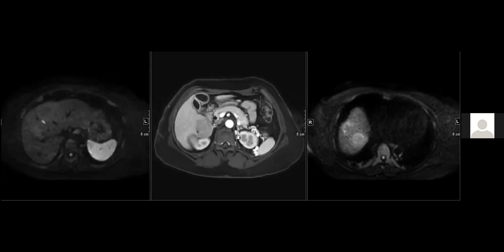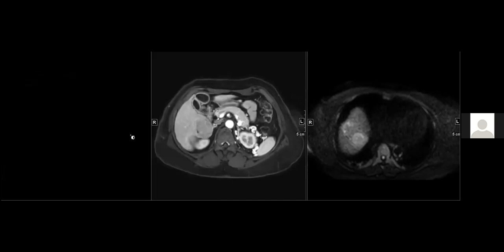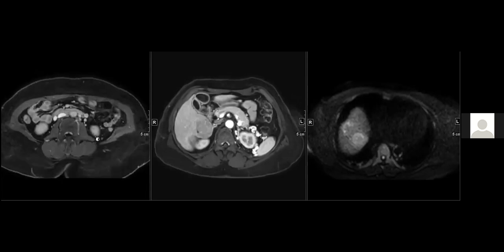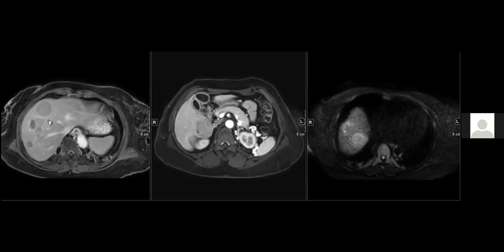So the patient didn't have to get a biopsy, and they just proceeded with treatment, and based on imaging features, this was presumed to be a multifocal HCC. That was just a good case. And you can see them here.